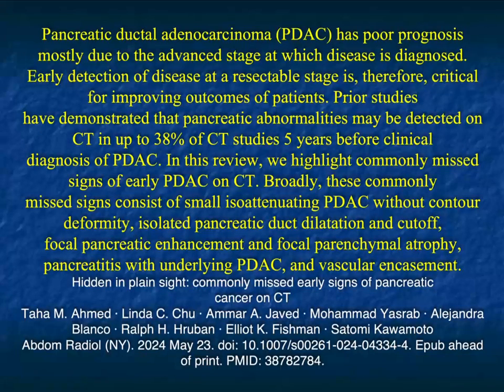We spoke about the liver in detail in the first part and just started getting to the pancreas. So let's pick up the pancreas. We'll talk first about adenocarcinoma. Obviously, we know the challenges of adenocarcinoma are early detection. If you can pick up tumors early, stage 1, stage 2, you talk about a 40 to 60% 5-year survival. And when you pick things up later, like stage 3 or stage 4, you're talking about a single-digit 5-year survival. So it's very important for us to try to optimize detection of pancreatic cancer.